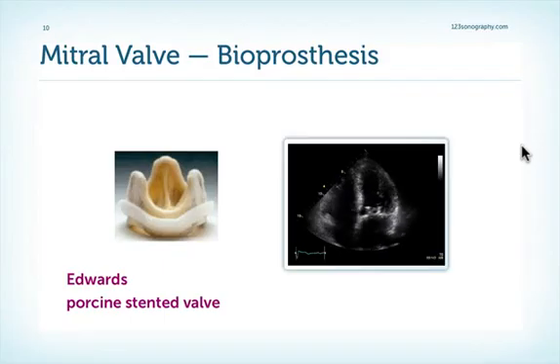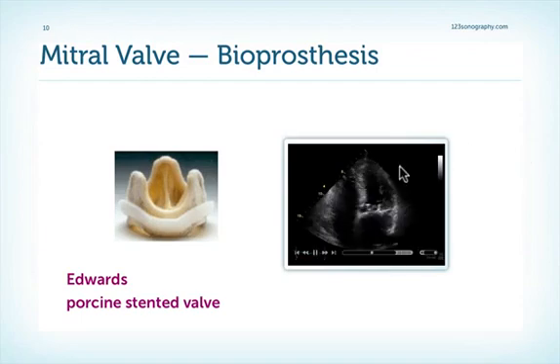Here's another prosthetic mitral valve, however this time not a mechanical but a biological valve. This is a stented valve.